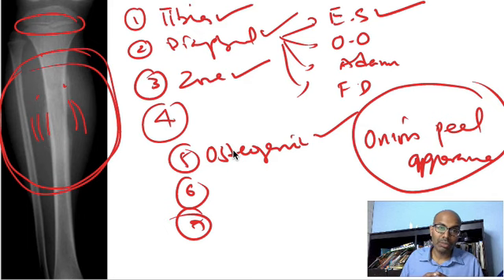So the malignant tumors that you can get in the exam are osteosarcoma, chondrosarcoma, and Ewing sarcoma. So if there's a young child, then it's probably an Ewing sarcoma. If it's in second decade, third decade, or fourth decade, probably an osteosarcoma. But you have to go through the X-ray in a systematic fashion, so that even if you do not recognize the X-ray in any way or form, you should be able to clinch the diagnosis.